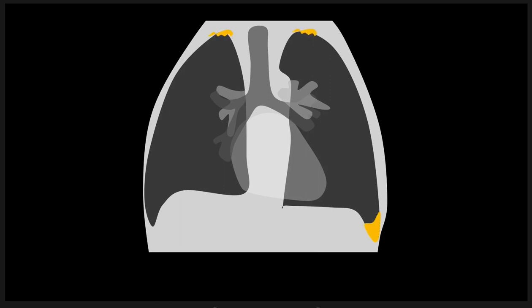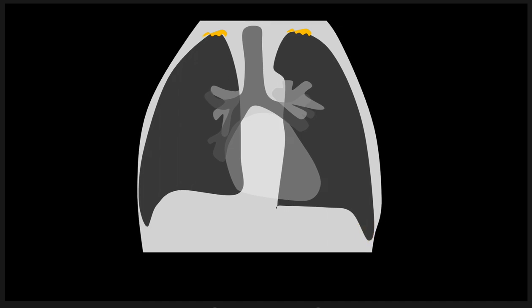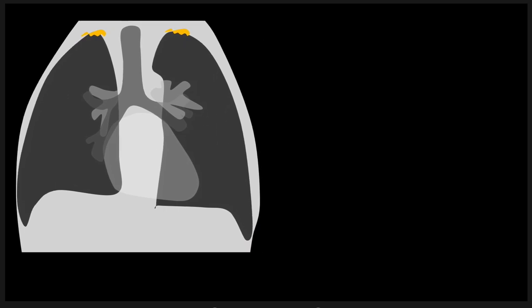So you'll see this a lot. They're, quote, ordinary type of pleural thickening. You see it at two main sites: the lung apex, which seems to be much more common, and then you can also have pleural thickening at the costophrenic angle, which can actually mimic a small effusion. We'll talk about the apical thickening first, since that's the most common.